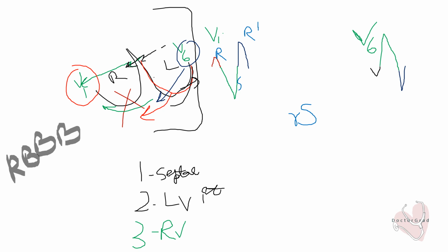Now the next deflection, which follows an S wave and is again positive, is again R. The amplitude is a little bit more, so you can call it capital R. This R and the first R shouldn't look the same, so you call it R dash. So it is an RSR dash pattern. This is what we get in V1 in right bundle branch block, and this whole pattern is called marrow. I'll say what it means: M pattern in V1 and W pattern in V6.